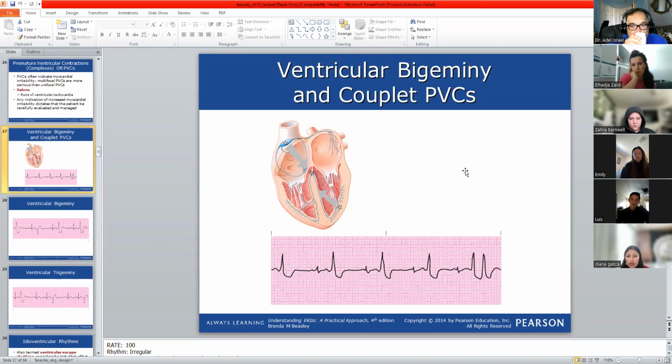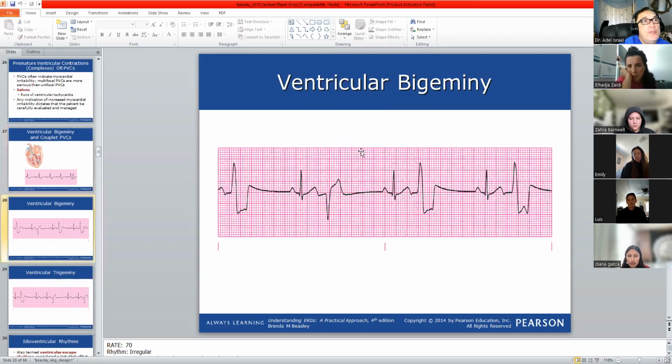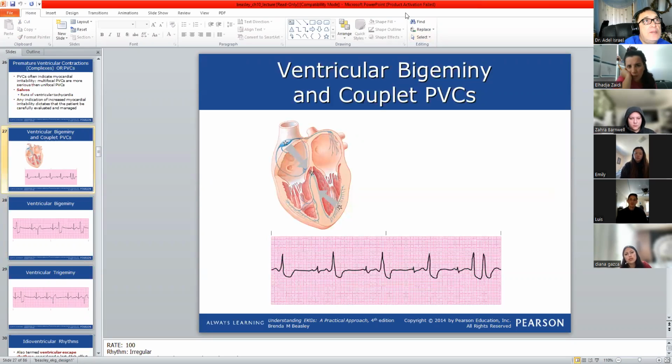Because every other beat is a PVC. 100% correct. So thank you. Let us go back here. I need to highlight the items with you to give a chance for people who keep quiet, not participating. So you say that every other beat. Very good. So which one is normal?